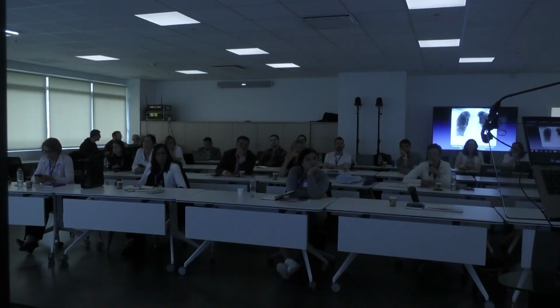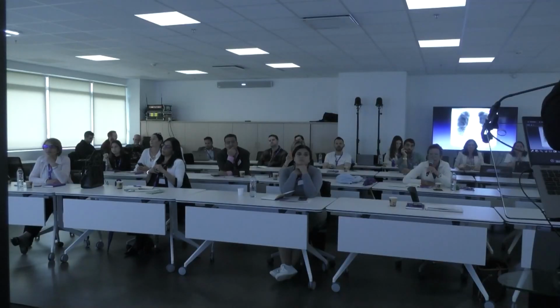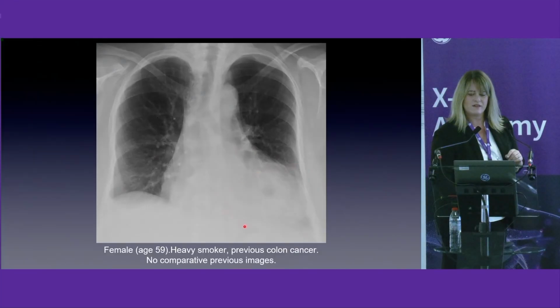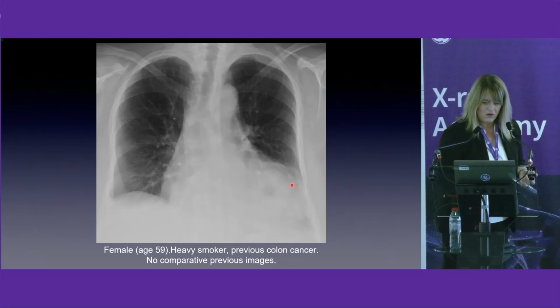Large, and she has emphysema. Okay. I don't know what happens on the left pleurodiaphragmatic. Okay. I like what you say. Okay, so I have some doubt here because I see an opacity. I don't know what this is, this transparency.